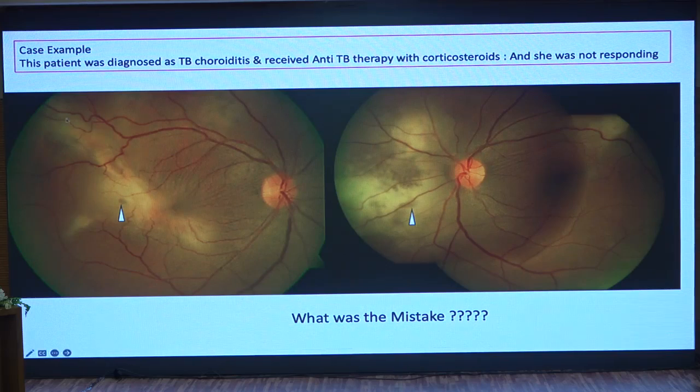Now look at this. What is this kind of structure here? It's linear, isn't it? If you have read your anatomy, choroid anatomy is what? It's lobules, isn't it? Choroid is not linear. So if the individual lobules are inflamed, you will get focal choroiditis. If they coalesce together, you will get diffuse. Why the hell would you get a linear choroiditis like this? So it is not choroiditis.